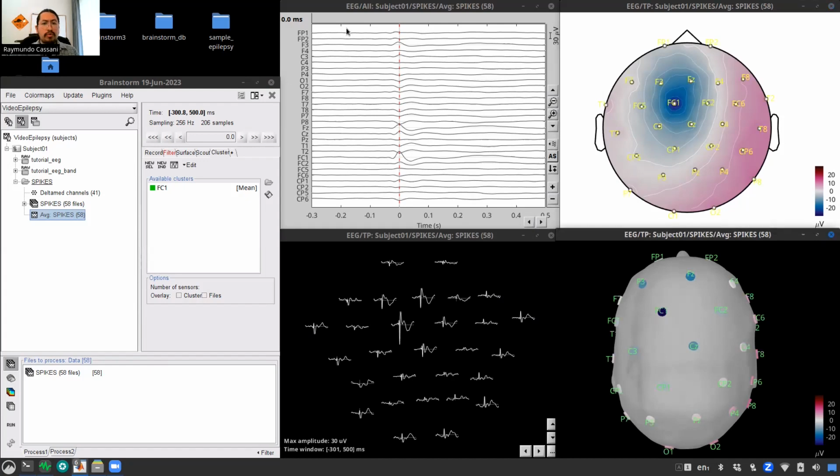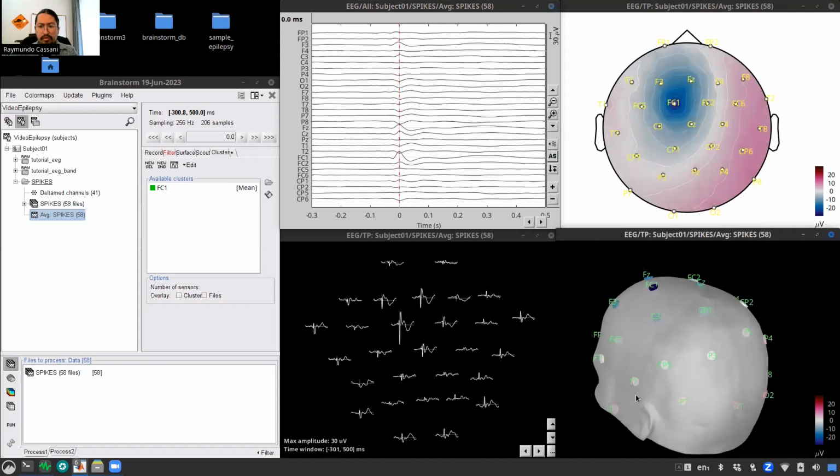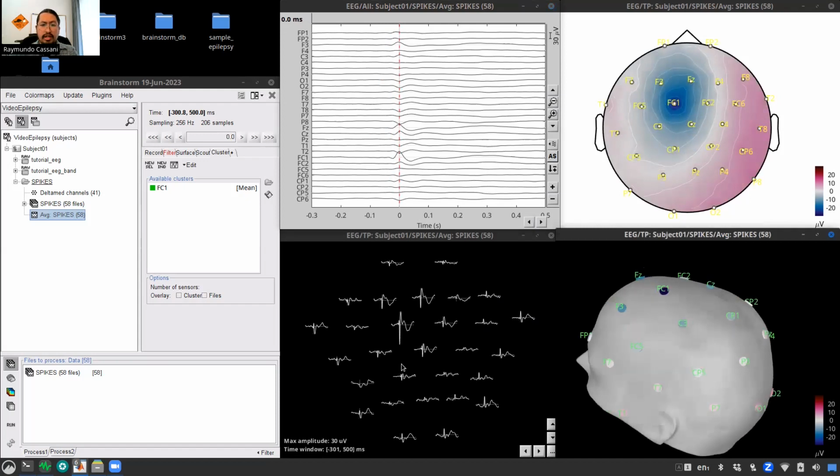And finally, we can move through the different times using the arrows on our keyboard to see the evolution of our data on the scalp. Using this plot in the 2D sensors, as well as all the traces in their respective places, it can shift to different times.